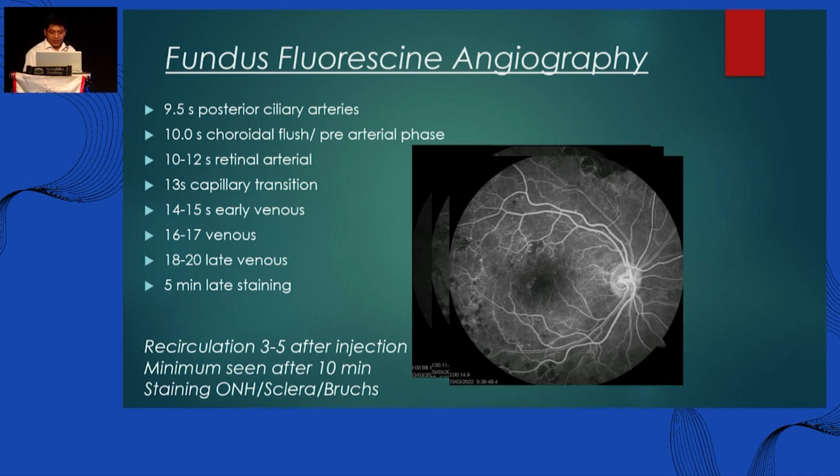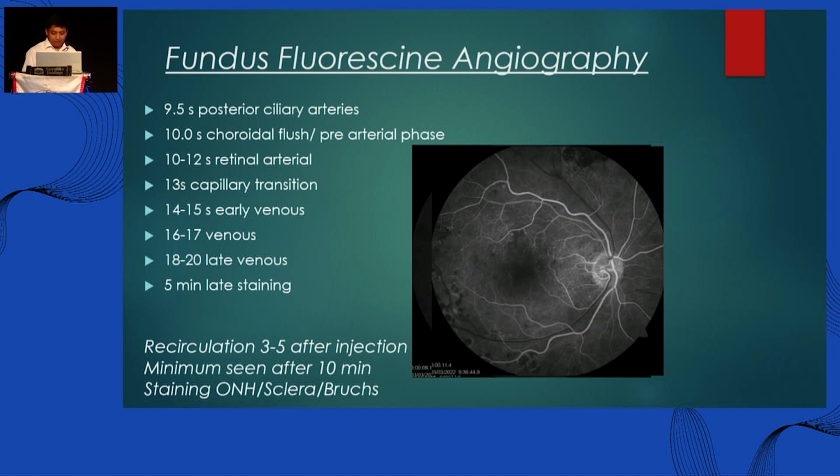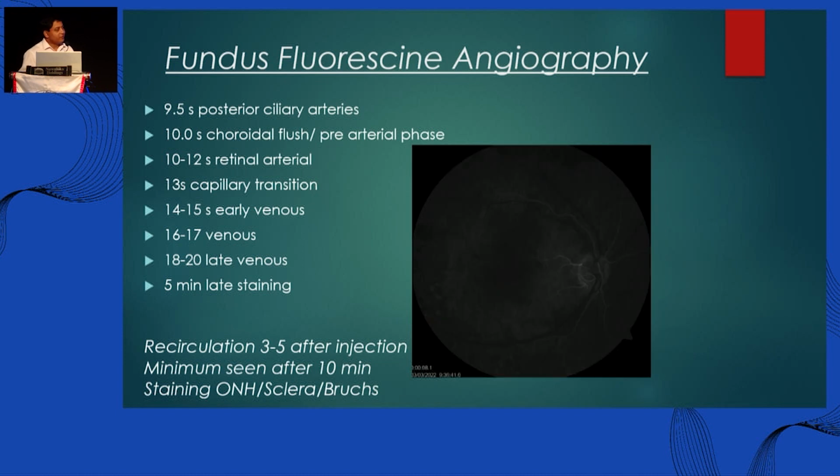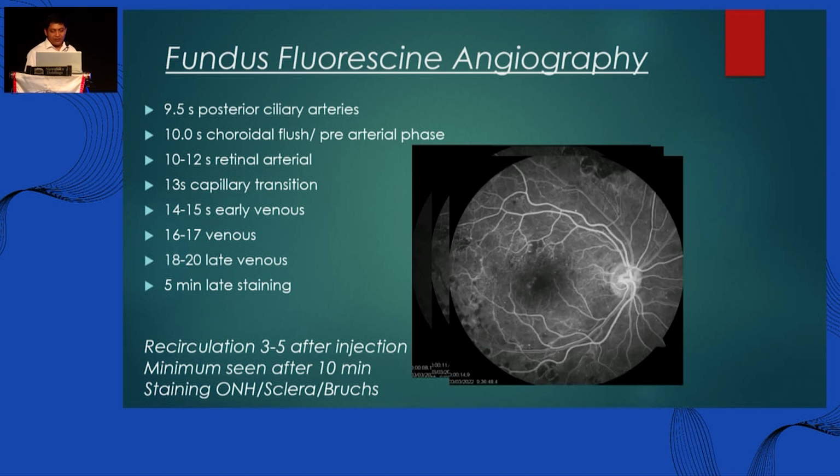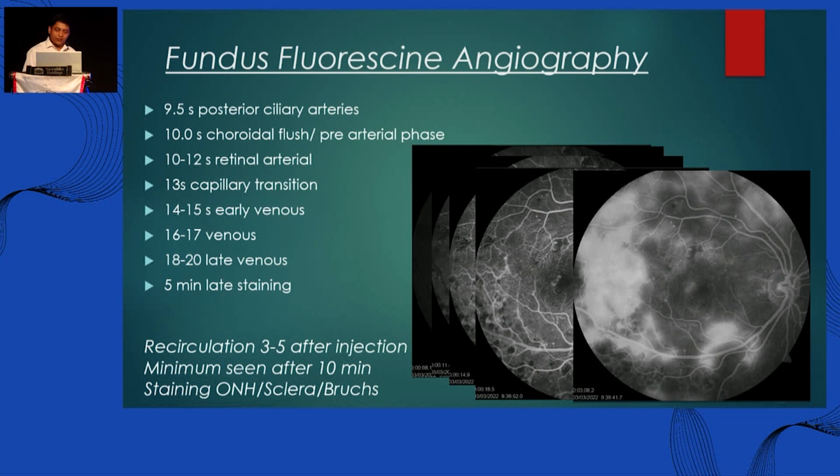Look at the pictures, it's very physiological. The dye enters the arteries, then goes to the capillary network, then the veins, then is washed out. It's what we know as circulation: arteries, then to the veins. So we are used to this pattern of thinking.